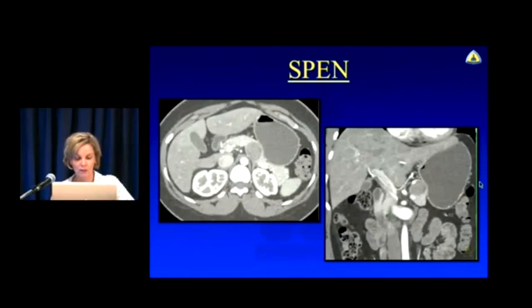And here's another one. This is kind of in the proximal body. Looks complicated, right? It doesn't look like those oligocystic serous cystadenomas or even a mucinous cystic neoplasm. It's like perfect, but there's definitely internal complexity to it. Based on the age, you're going to go with SPEN or a mucinous cystic neoplasm. There's no duct, right? There's no reason to call it an IPMN.